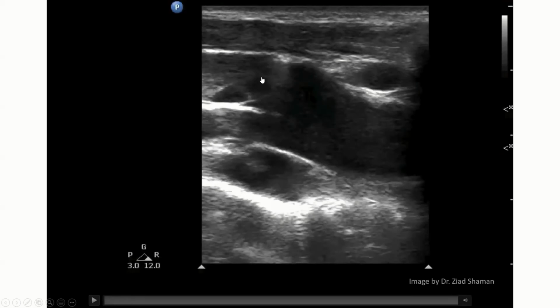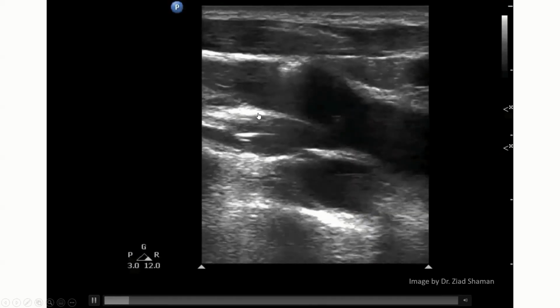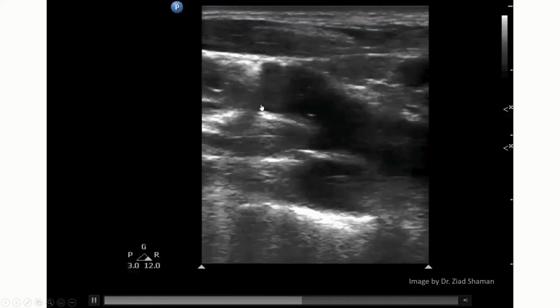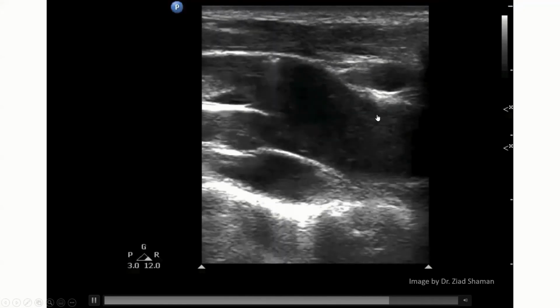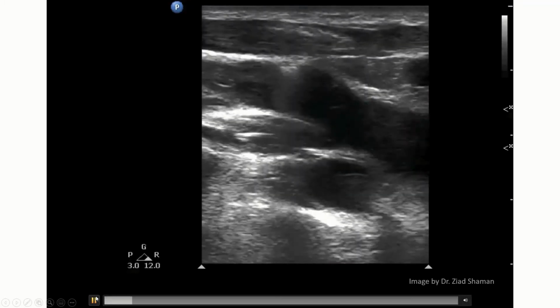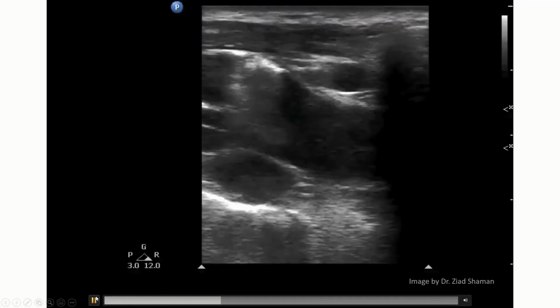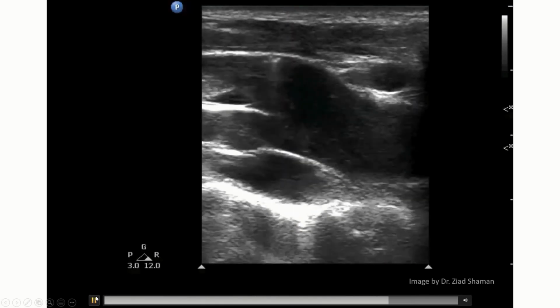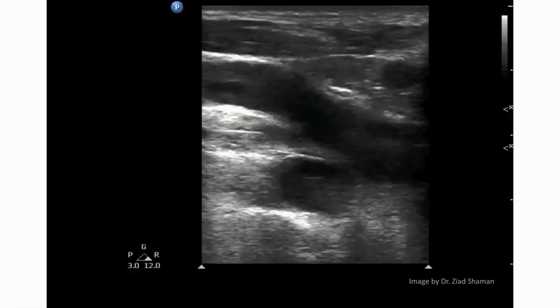This is actually air bubbles in vessels coming from IV. So there was a bubble in the IV and then it came from the peripheral IV to this central venous system. This is also the artifact caused by air bubbles.